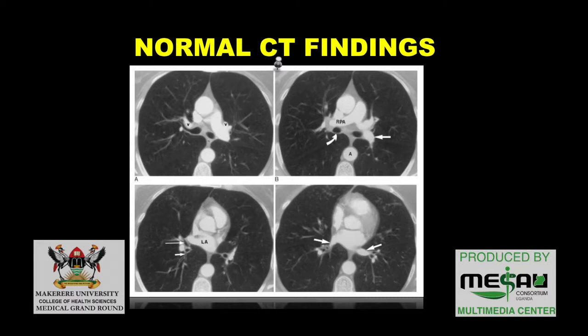Depending on the series, sometimes they are contrasted and sometimes non-contrasted. So some of these structures look brighter in some cases, and in others they look dull. You appreciate that they are contrasted when we have added a reagent to enable the structures to come out better.